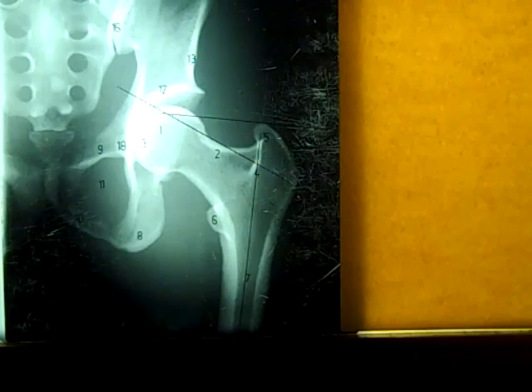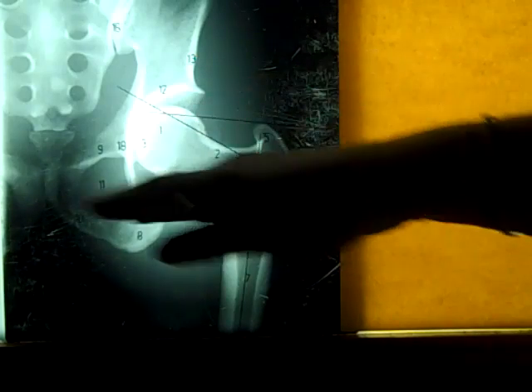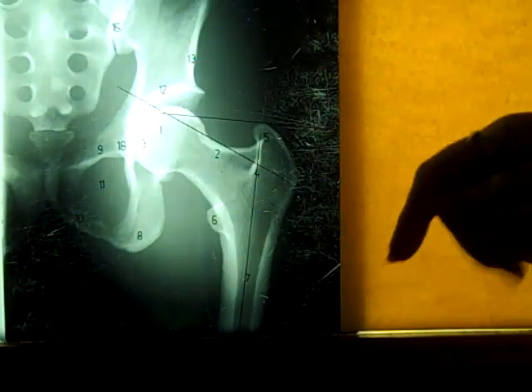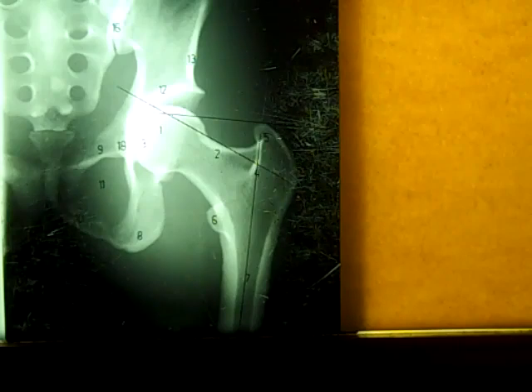Now, what you would do, of course, is that you would do Klein's line on the patient's other side, and we check to see if the number on this side matches the number on the other side. If you do have a match, then it's called bilateral symmetry, and that is considered normal. If you don't, then you need to be worried about something that would cause a disassociation of the femur, and that would be, again, fractures or dislocations, things of that nature.